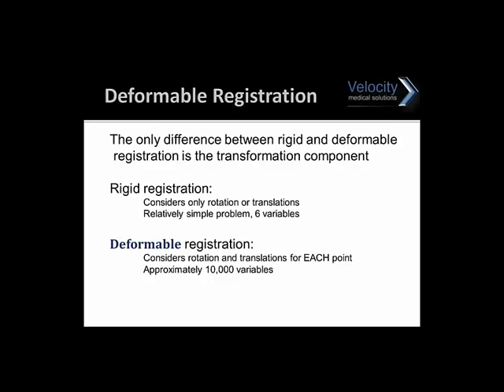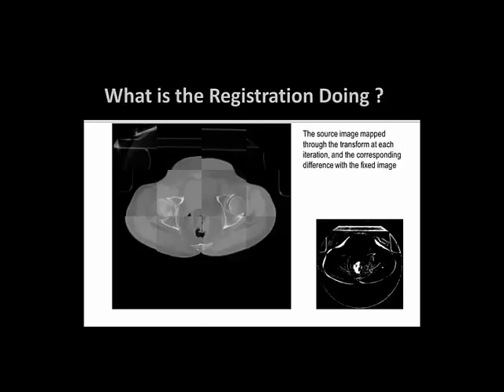As the animation begins, you'll see that the planning CT is going to wobble and move a little bit to better fit along to the cone beam CT. So as it moves, again in the lower right corner, you can see that cost function trying to maximize the black. And this is just on repeat. So if you see it go back to the white, that's the initial starting spot. And then as it deforms, we get more and more black. So that's when the algorithm stops, when it has the most black that it can.